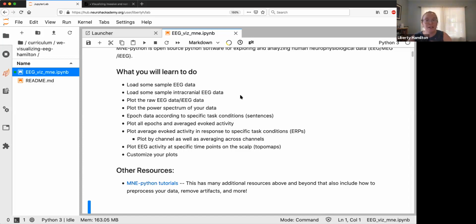So if you're looking to plot propagation of seizure activity, you can find that a little bit easier than task-related intracranial EEG. In any case, I'm providing this. That should also be in the data directory if you go up all the way, but this notebook will load it automatically. All right, so you'll be able to load the data, which is from our lab.